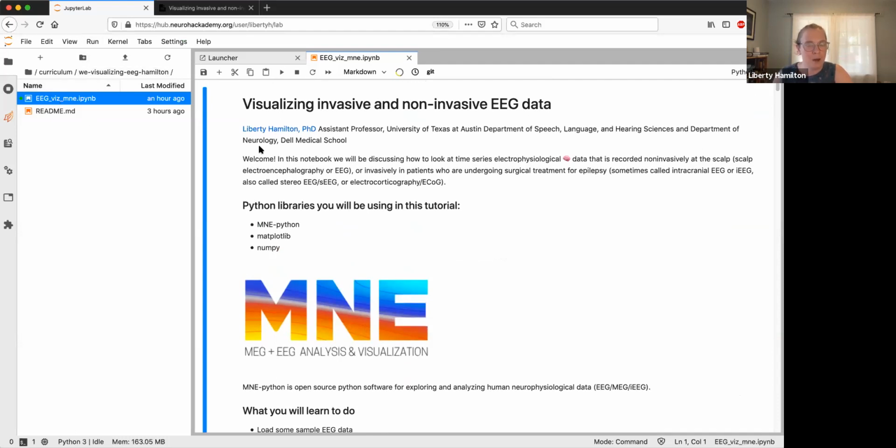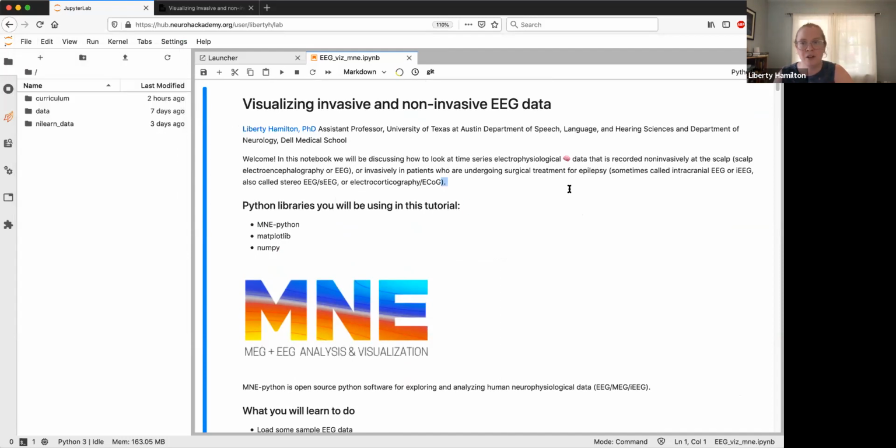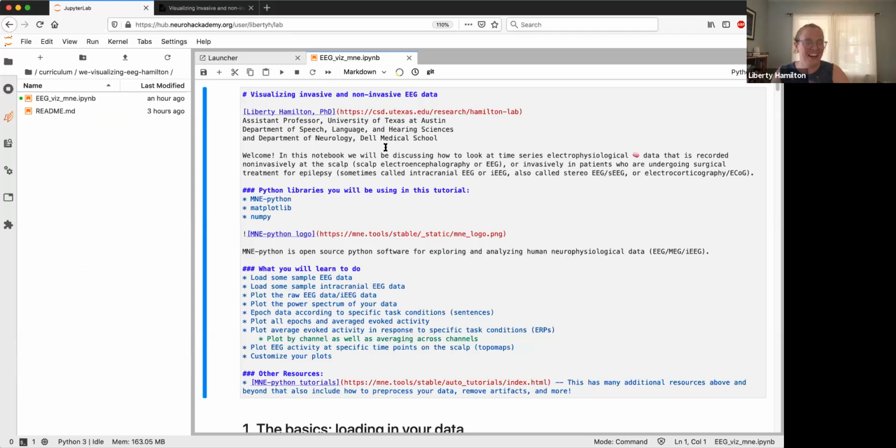So this is the NeuroHackademy Hub. Hopefully you have already seen how to use this in some of the tutorials. If not, when you first launch it, if you find that some things are not working well, you may need to go into the Hub control panel and restart the Hub, hopefully not. But my tutorial is in the curriculum, visualizing EEG, and I know it's Wednesday, but I like that it sounds like this is a thing we're doing together. We're visualizing EEG. And you will just open the EEG Python Jupyter notebook.